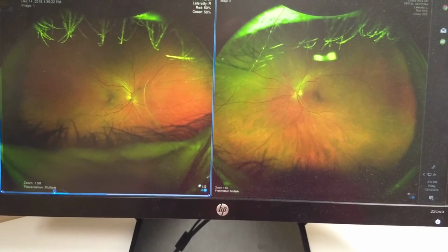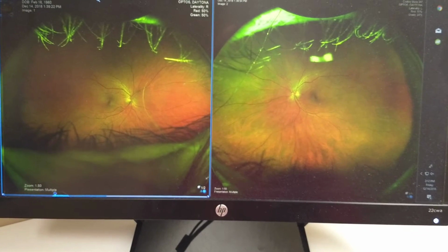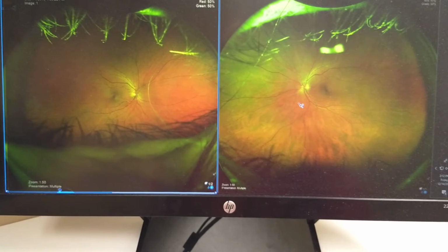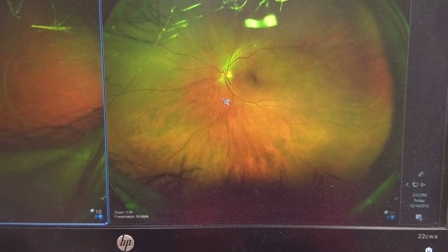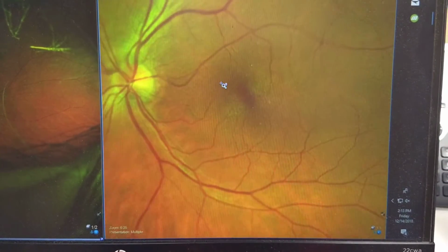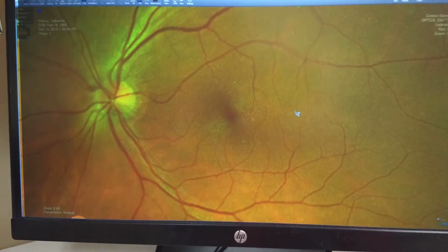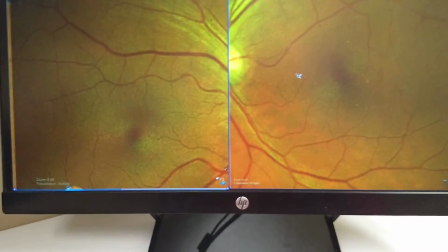Now for some reason it doesn't quite make them exactly centered sometimes, or even exactly zoomed in the same. And so what I've had to do sometimes is, right now when you first log in, it's on the zoom function. So I got my cursor here, I hold my left mouse button down and push up with the mouse, and it zooms in like that. Oops, I double clicked it, and when it double clicks it just takes over the whole screen. You have to double click it again to go back to both pictures.